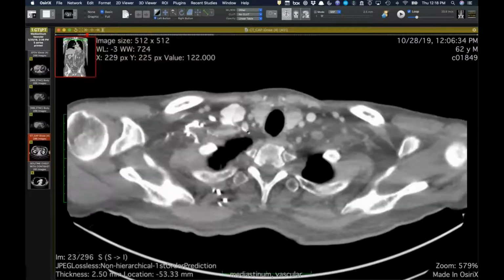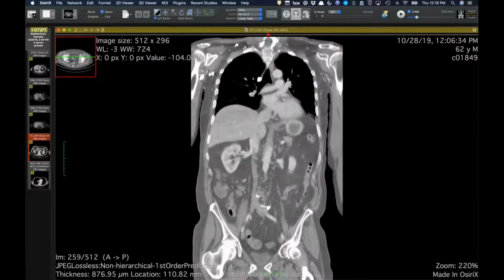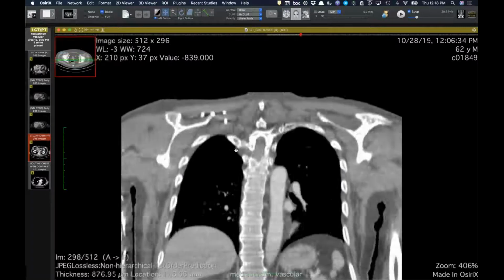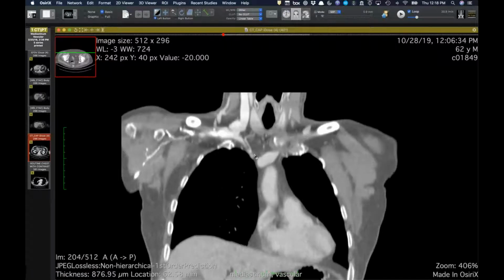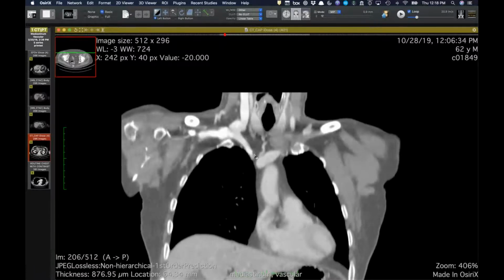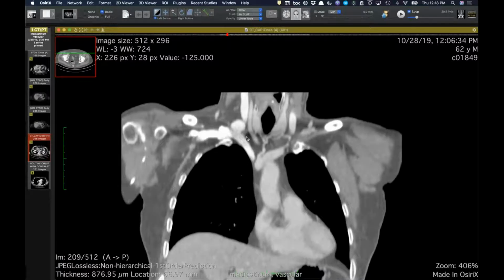internal jugular vein. Do you call this just a varix or an aneurysm, or what would you call this? I mean, it's not a lymph node, that's the important thing, because it can be mistaken for one. And there's probably a valve right here, which increases the dilation. I think probably varix would be a better name. Yeah. Interesting how it's totally dilated like that, almost circular.